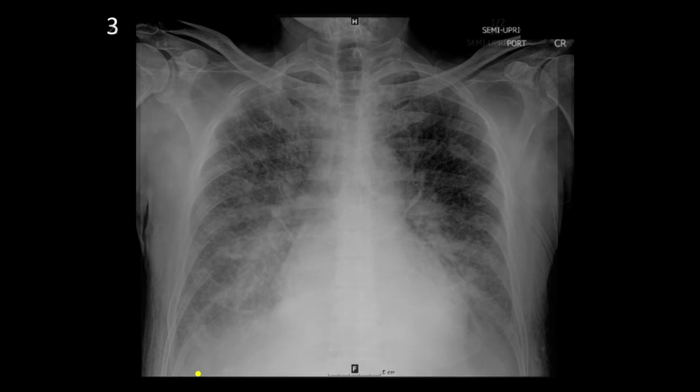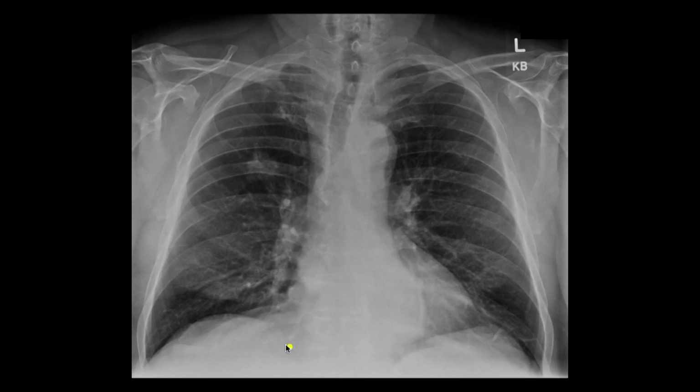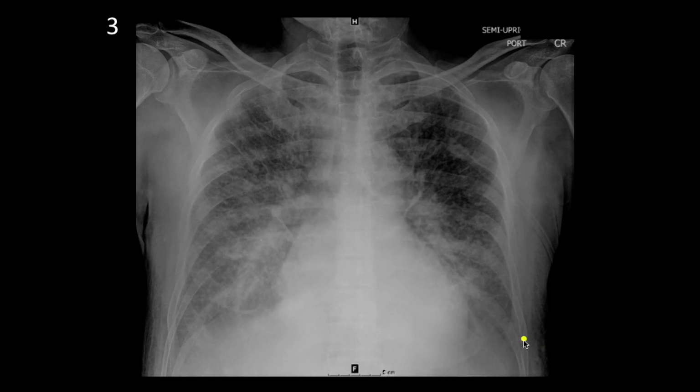The patient continued to deteriorate, and now again you can see that the heart looks enlarged, and you're now getting these fluffy areas of increased density in the lung compatible with alveolar or airspace disease, and so this is florid pulmonary edema. So you can see it can progress from interstitial pulmonary edema to alveolar edema. And again, at the lung bases in that case, you can see that there's blunting of the costophrenic angles, hazy opacification at the lung bases, and almost all of these patients are going to also have pleural effusion.